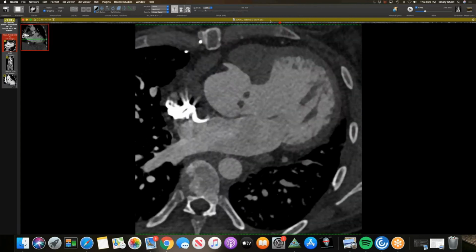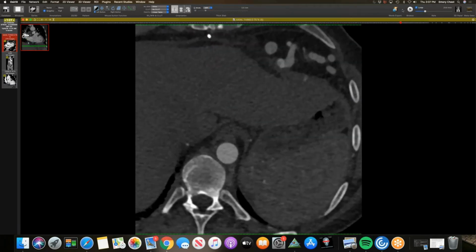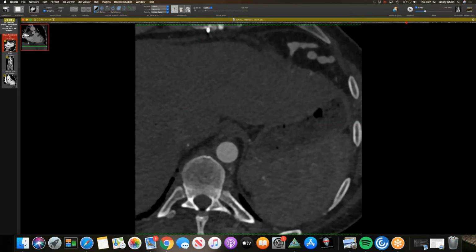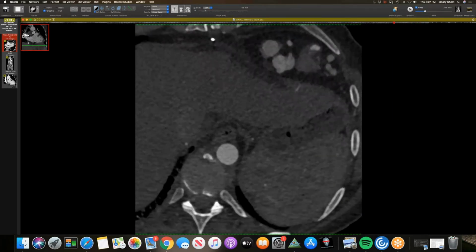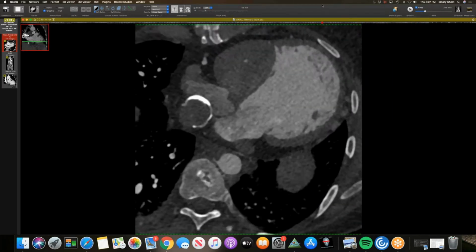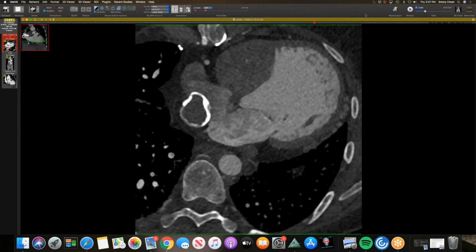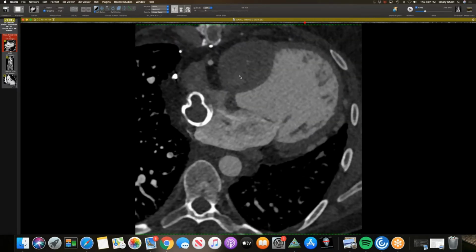Okay. And it was probably congenital, but I think in a normal patient it wouldn't be a big deal because the blood is still returning to the right side. But in this case, I think it might be important because one of the functions of this Fontan is to shunt, to prevent blood from going into the hypoplastic RV.